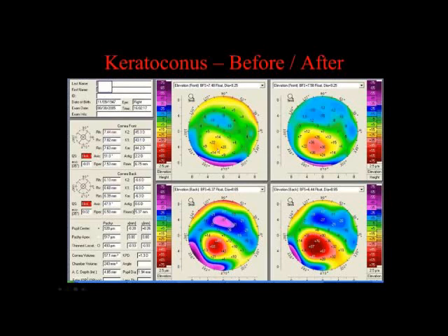Here is another example. I don't think anyone would miss this using the standard reference surface, but notice how it increases in magnitude with the enhanced reference surface. Posterior surface, again, I don't think anyone would miss this, but notice how it increases in magnitude. So again, going from the standard reference surface to the enhanced allows the ectatic region to stand out, just like using sea level allows Mount Everest to stand out better than using a best fit shape of the Earth.